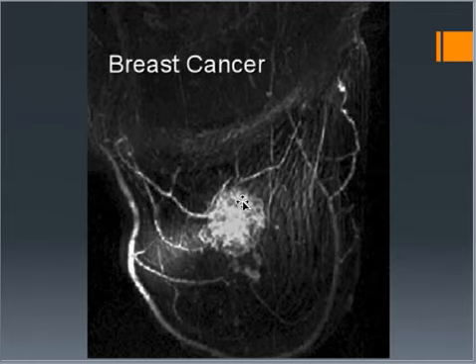This is a breast cancer. Remember last module when we talked about MRI imaging of the breast? Here you can see that cancer or mass right here in the breast tissue. Again, not usually done as a first line of defense, but if they see something on the mammogram, then they'll follow up with MRI sometimes.